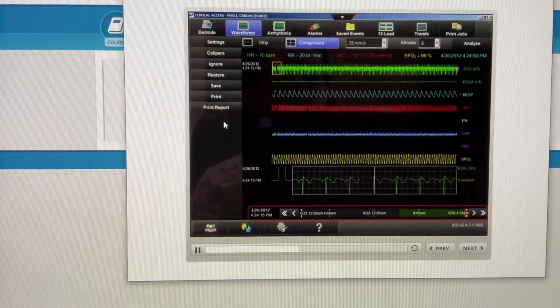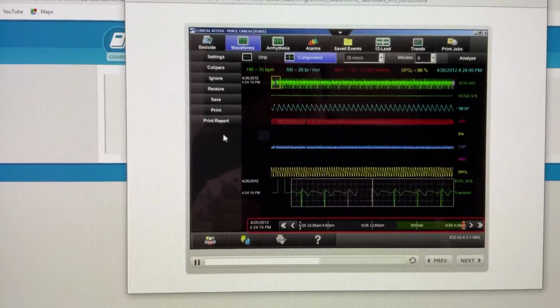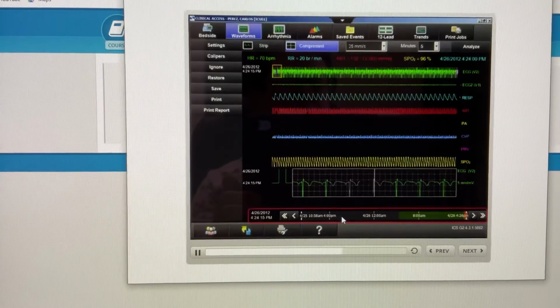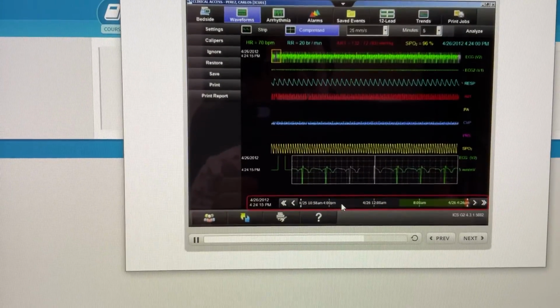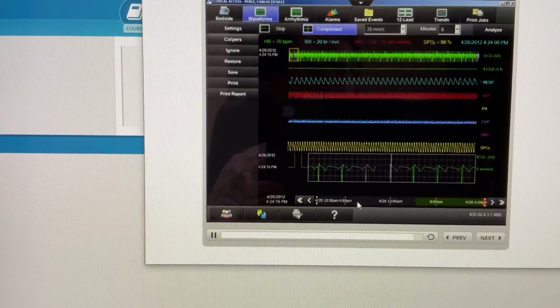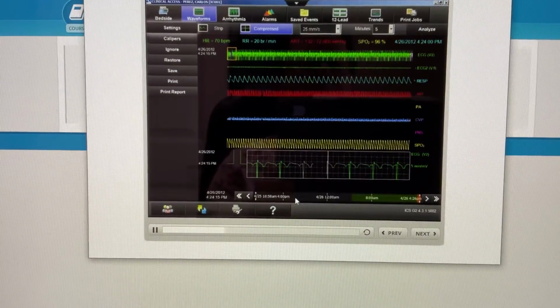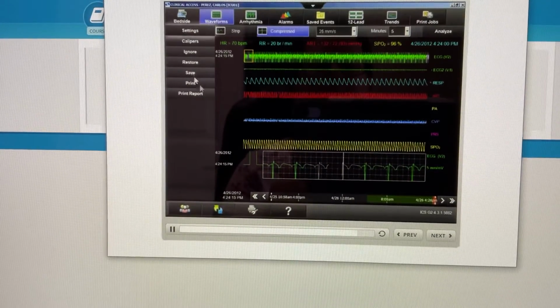There is also a timeline at the bottom of the screen, just above the system control keys. The timeline reflects either 72 hours of patient data or the time since initiation of monitoring up to the current time. The Waveform view opens with all monitored parameters displayed in compressed view. To change the parameters displayed, click on the action key labeled Settings.